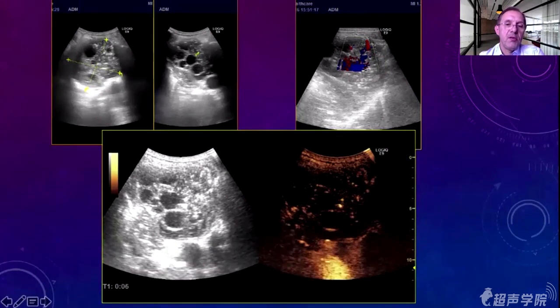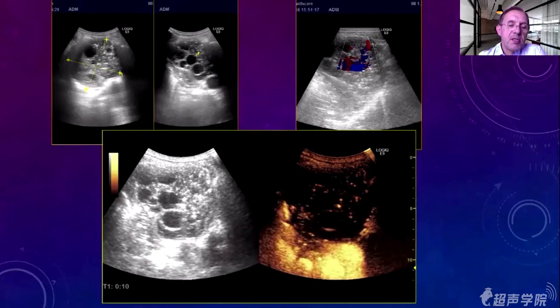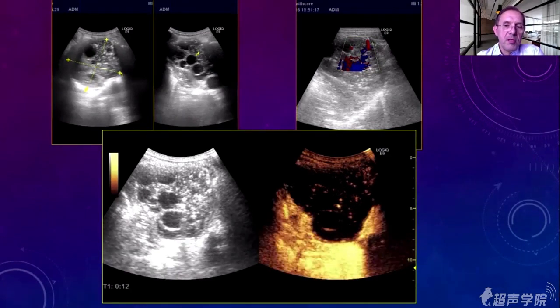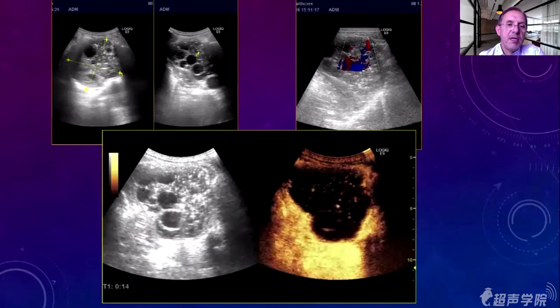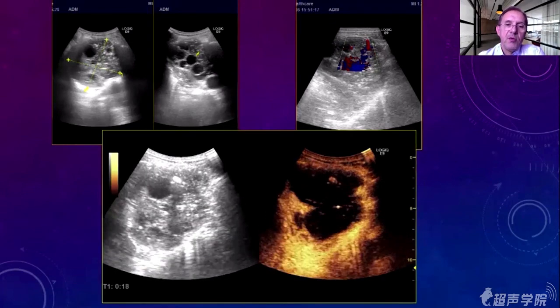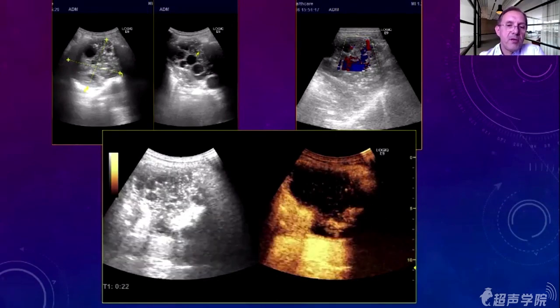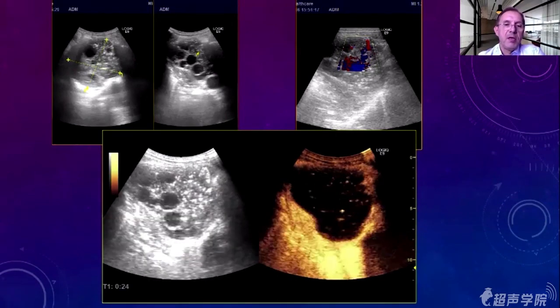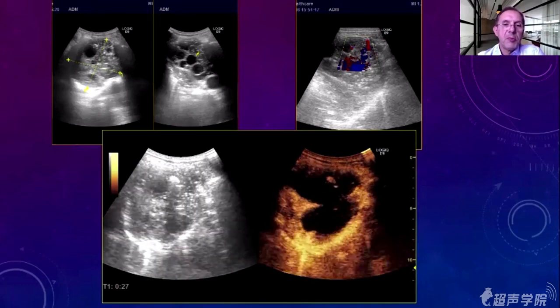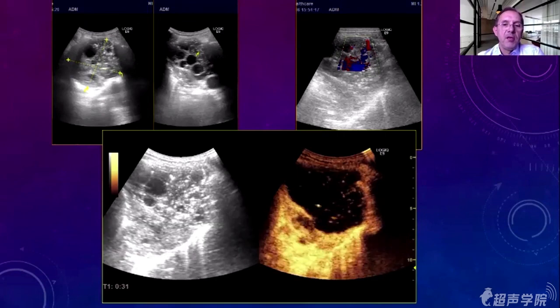We injected contrast, and we were almost sure that this lesion was not a tumor, because it was clearly avascular. It was a hydatid cyst, so we skipped the biopsy. We sent the patient back with that diagnosis, and the patient was operated. So, the information sometimes may be very helpful before a biopsy.